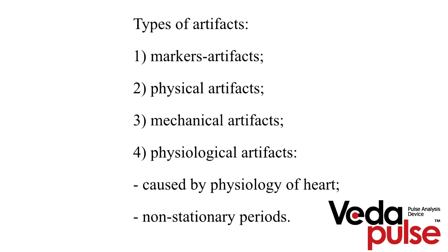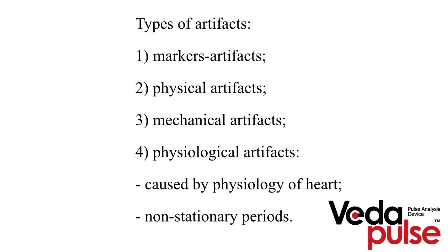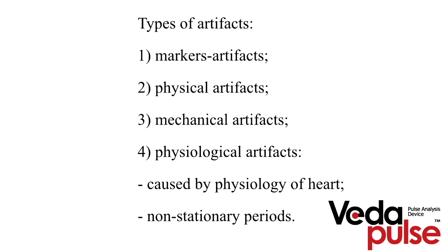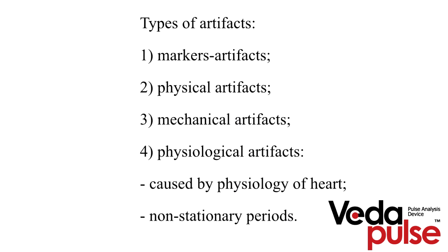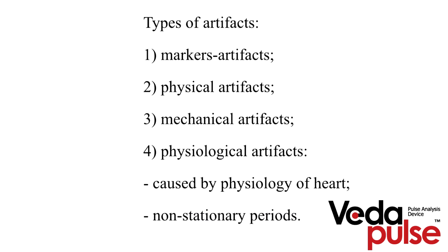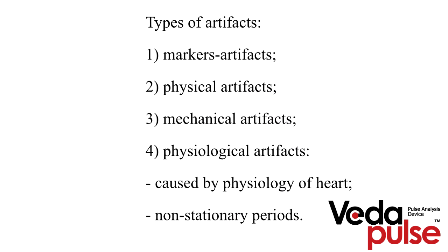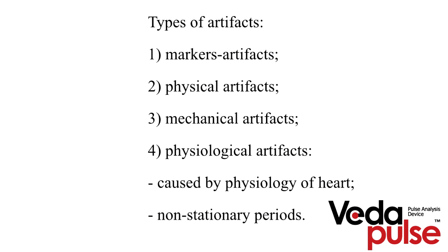Another reason for physiological artifacts appearing may be non-stationary periods. Such periods develop from the speech of a patient, his breathing manoeuvres, switching to some mental processes, some external factors, as for example falling asleep or meditation, or some stress reaction. Let's learn to edit each type of artifacts.